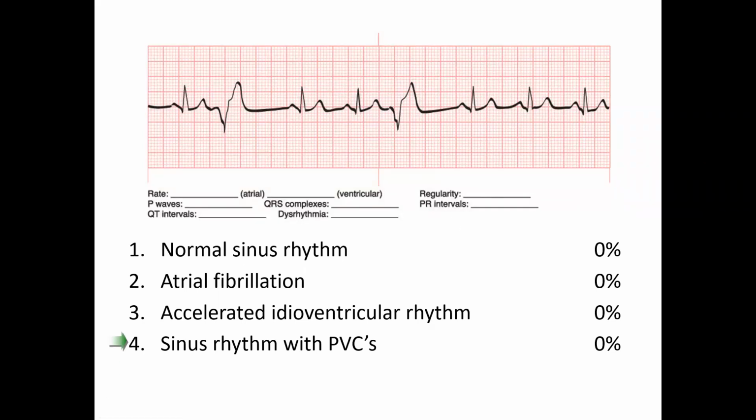So if you're palpating a pulse and you feel it, boom, boom. So here, if we're palpating this individual and they had an A line in, you would feel boom, then nothing, boom, boom, nothing, boom, boom, boom. That's what you're feeling if you're palpating the radial artery, like if you're getting ready to do an arterial stick or something of that nature. So PVC would be a premature ventricular complex.